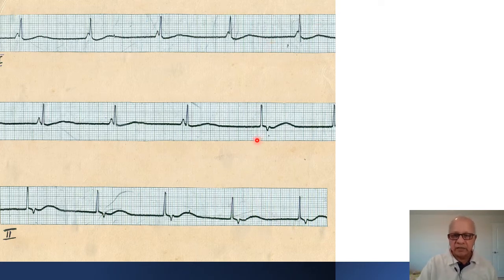Later what happened? After the upright P waves, the sinus P waves, the next sinus P wave fails to appear. Because it fails to appear, the junctional rhythm produces a retrograde conduction upwards of the P wave, and that goes and captures the atrium. From then on, continuously, the P wave is retrogradely conducted upwards because the sinus P wave is not coming at all. I hope you got the point very clear.